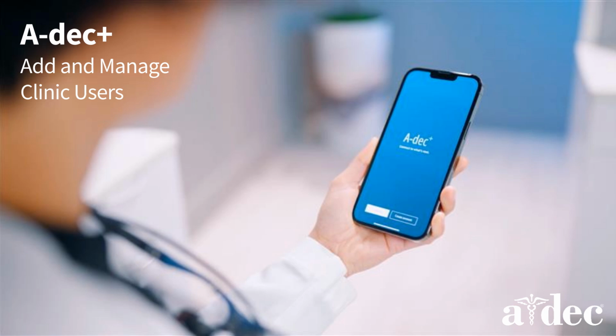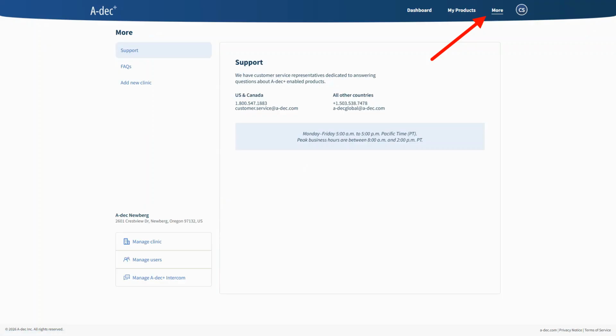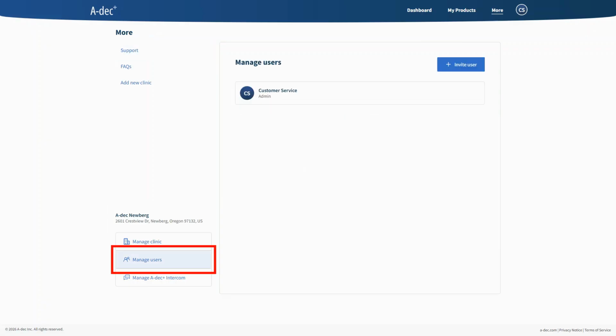In this video, we will discuss adding and managing clinic users in A-dec Plus. To add or manage clinic users, you must be a clinic admin. Begin by navigating to the More tab. Confirm that you are in the desired clinic. Then select Manage Users.